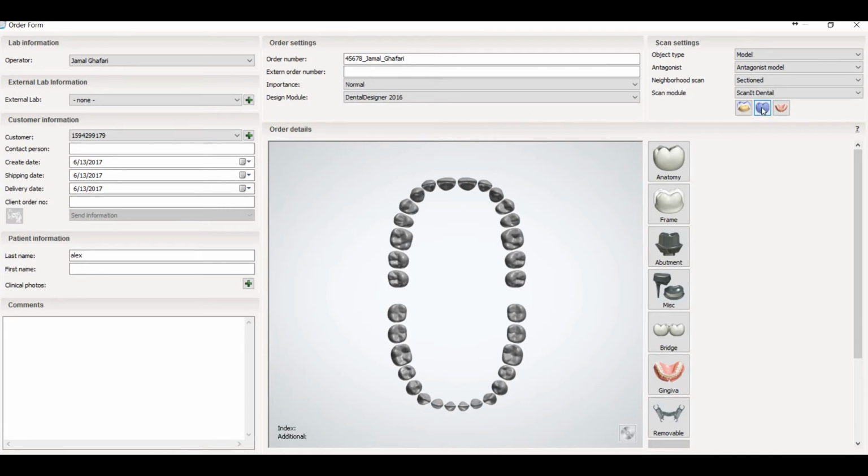So for the double preparation, you have the option to align the scans in the scan. During the scan, you can align two scans. But if you select pre-preparation and you have two different models, you don't have any option to align them at the scan stage. So if you have two different models, select pre-preparation. And if you have the same model and you have something like a wax up or the temporary of the patient, you can select the first option.